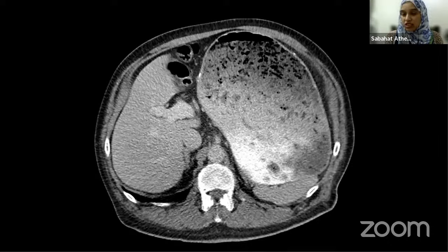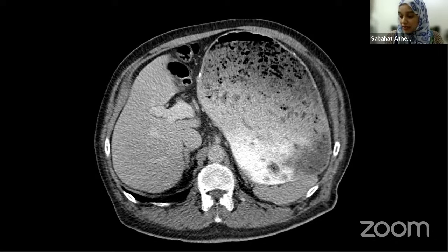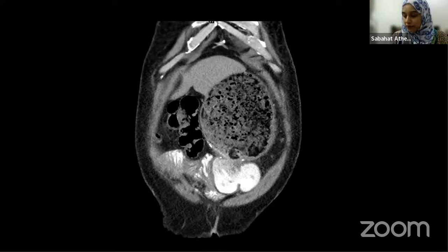There are two reasons. Usually there are two sets of cases, two sets of patients where we see bezoar, right? Yeah, we have hair. What else? Hyperdense liver. Well picked up. Let's leave it. Tell me the reason of bezoar in this patient. Psychiatric patients. Excellent. Yes. There is another group of patients who can have bezoar. Excellently picked, said psychiatric patient. Okay, this patient was completely sane. No psychiatric problems. So what do you think is the reason? Excellent. Gastric surgery. Yes.